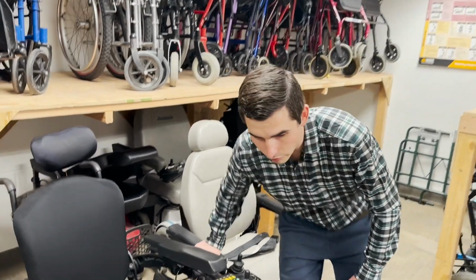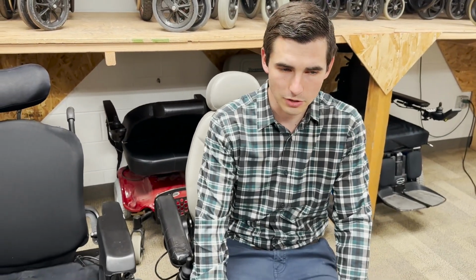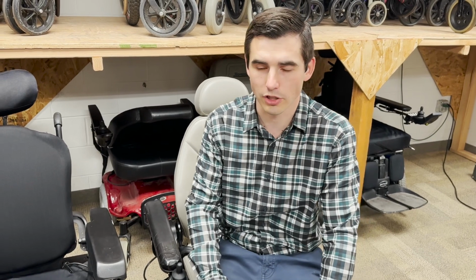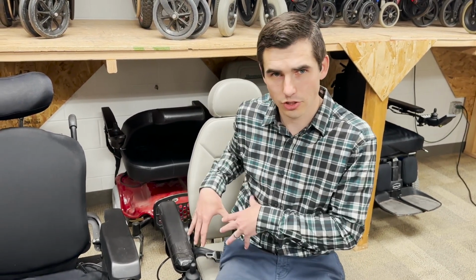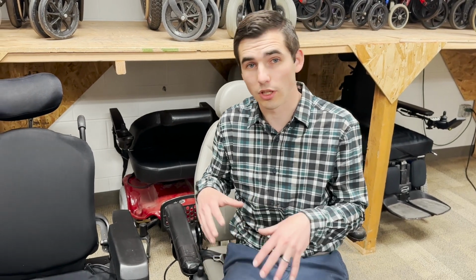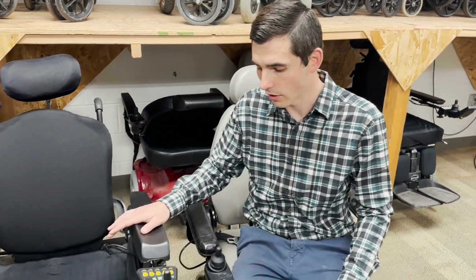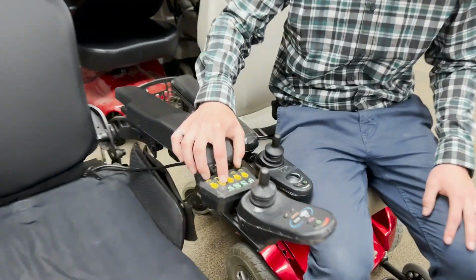If you are sitting for a while, say in a car or in a class or something, every once in a while, maybe 10-15 minutes in the class, you'll do a little subtle shift or even just a lean or whatever. Any of those movements is a pressure shift. For someone who can do that, this chair is perfectly adequate. For someone who cannot do that, hence someone who's living in it for most of the day, then this is a chair for them. This chair has a lot of the powered features on it.